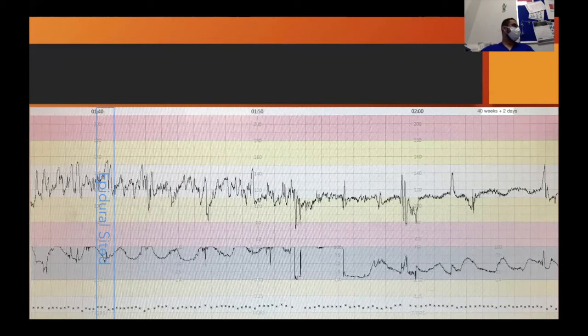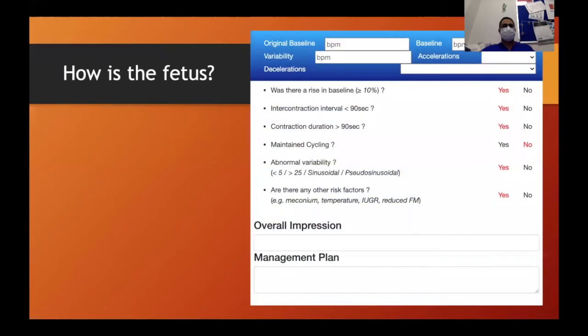It's happy. Once we've established that this baby is fit for labor, for any future assessments you are going to start off by doing just a basic description. Always start out by remembering, okay, what was the previous baseline? Where did I start from? Because noticing that there's a change in baseline with time is the key to picking up chorioamnionitis, infections, stress, etc.